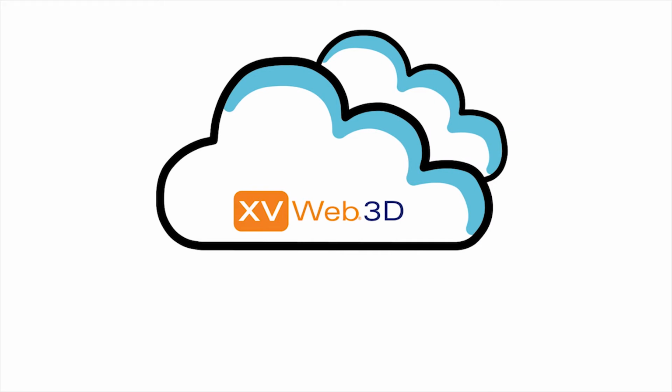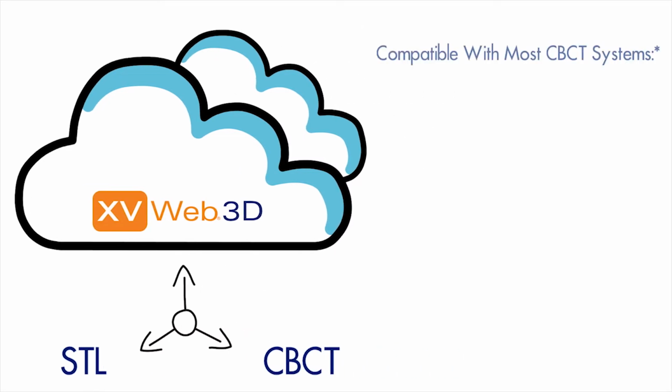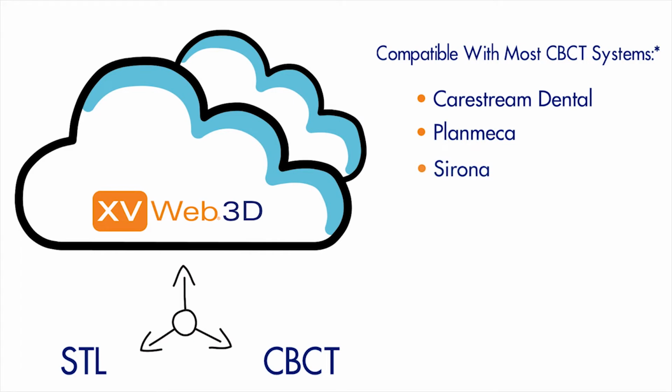The new XVWeb 3D module allows for STL and 3D CBCT datasets to be stored, retrieved, and manipulated via the web. The XVWeb 3D module will integrate with the majority of CBCT systems on the market today, including Carestream Dental, PlanMeca, Sirona, Vatech, Rayscan, and many more.